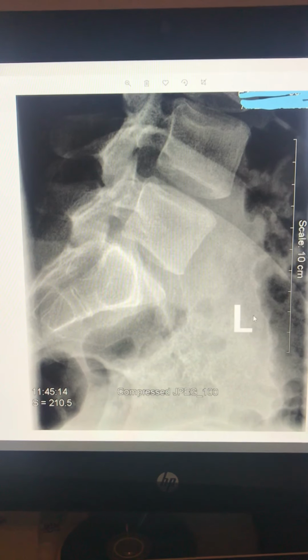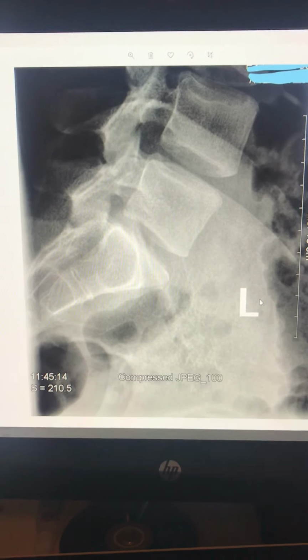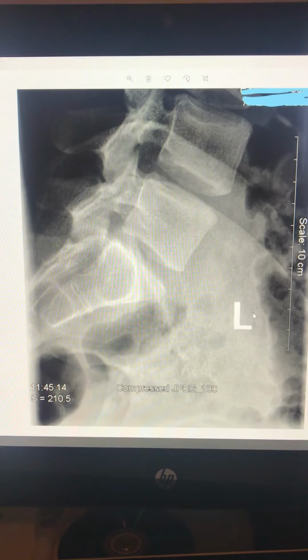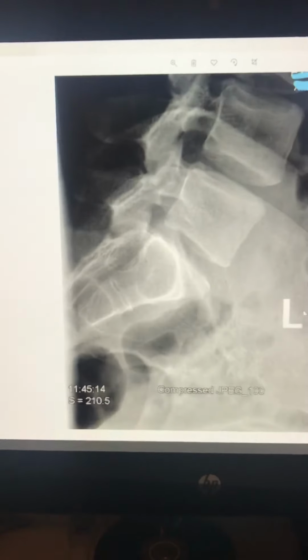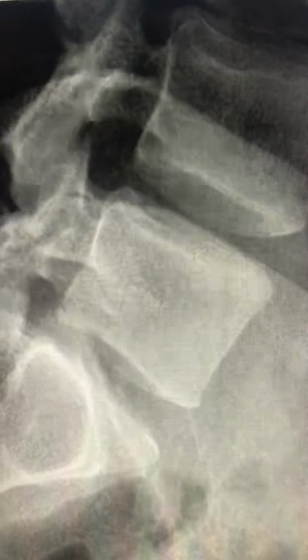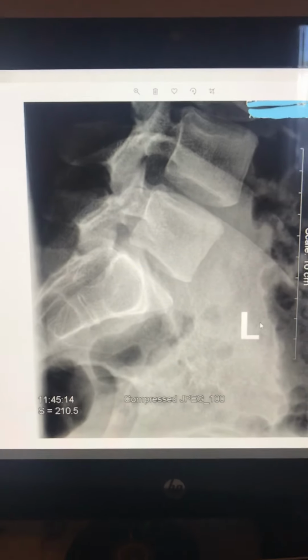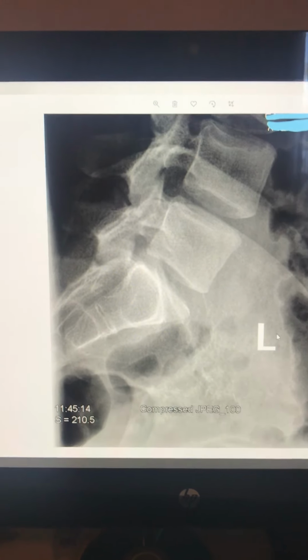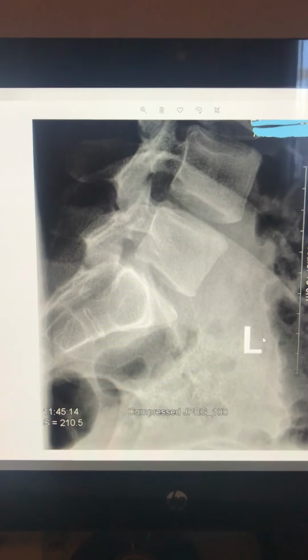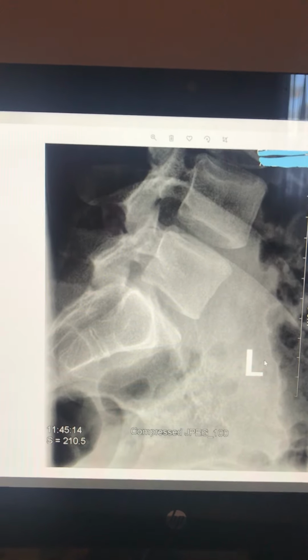I think that the mAs could have been increased. The images aren't going to be as good as this, but it's kind of grainy. So I think the mAs probably needed to come up to take care of the mottle and graininess.